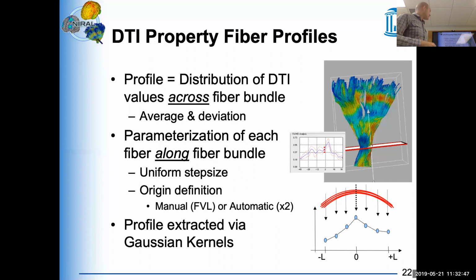What's the definition for the automatic method? What is it looking for? Well, what it does is go along all the tracts, and it tries to find the center point, and then computes the median over all the center points that you have. And then at that median, it computes the plane that's orthogonal to the local fiber direction. Okay, that makes sense.